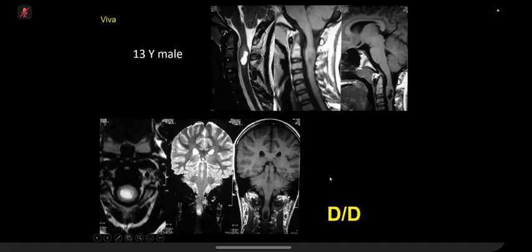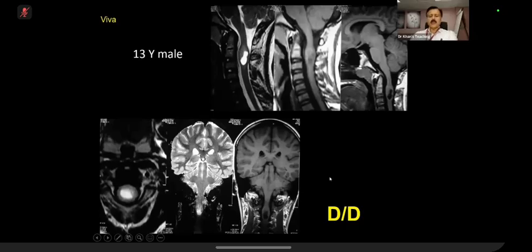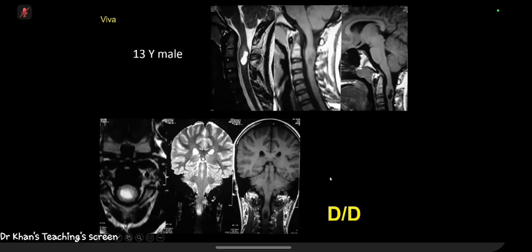So in this age group, I think hemangioblastoma is also another possibility. Ependymoma would be unlikely in this age group and doesn't have the right characteristics. So it would be between astrocytoma and hemangioblastoma. Right. Why did you say that ependymoma is unlikely? So I would expect there to be hemorrhagic signal. It's more common in an older population, and you tend to get a hemorrhagic cap with it.